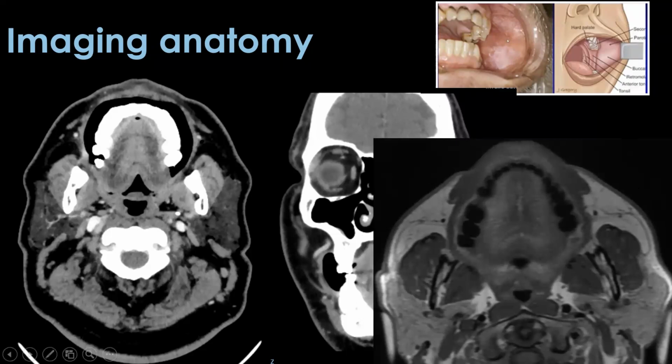This is an MR image to emphasize the fact that the soft tissue contrast provided by MRI is extremely high. First, I'll tell you which sequence this is. This is a T1 weighted sequence. We can see the spinal canal, vertebral canal, and this is the spinal cord surrounded by CSF, which is hypointense. That is a sign: when fluid is hypointense, it is a T1 weighted image. And anatomy is always seen on T1 weighted images.